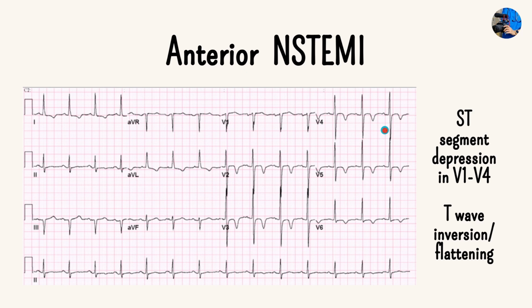Now, a non-STEMI, on the other hand, can present as an ST segment depression. So remember, a STEMI is obviously showing an elevation. That's the one we hear about a lot. But actually, a depression can also show ischemia and indicate an MI to us.